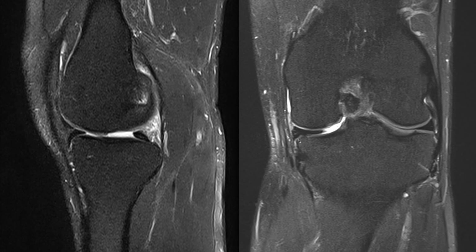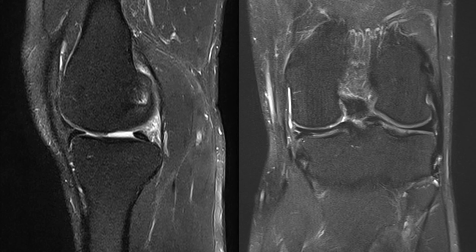Just a final point in terms of displaced meniscal fragments, that unlike entities such as osteochondral fragments, which can become displaced and loose in the joint, meniscal flaps almost invariably maintain some communication with the meniscus from which they become displaced. And this is a useful feature which can help in their detection.